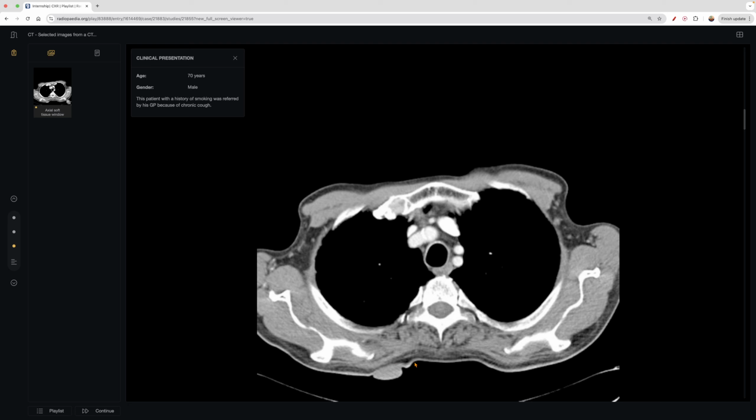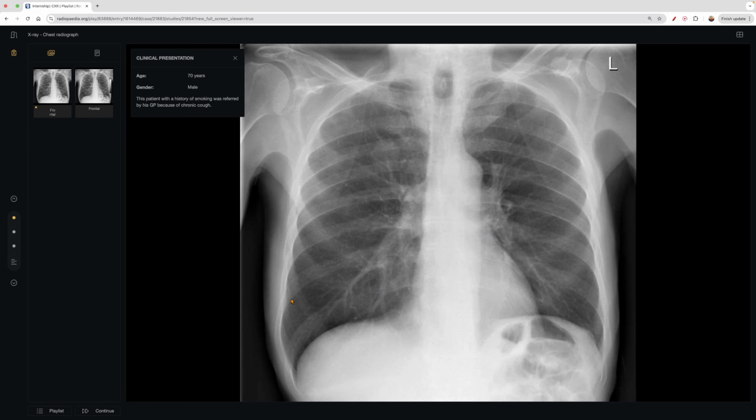You know, some kind of seborrheic keratoses. If you think about neurofibromatosis type 1, those patients have an abundance of them, and you can see that on the imaging, and that's something to keep in mind here as well. A radiograph is a 2D image, so we need to get more context clues, okay? Well, that was our final case.